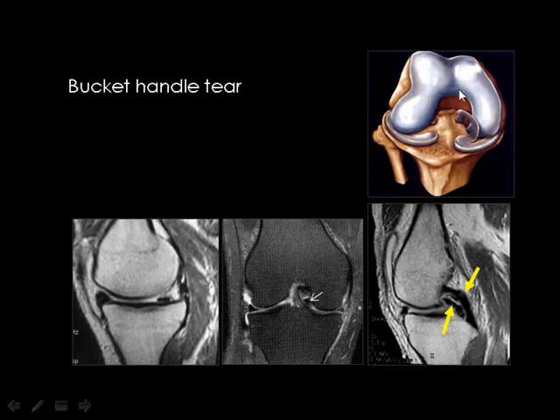And in intercondylar notch you find the cruciate ligaments, the medial and lateral. Okay? And the posterior and the anterior. The posterior is a little bit medial and the anterior is a little bit lateral. Then if you look at the level of the posterior cruciate ligament, you will see the missing part of the meniscus. Look at here. This is the posterior cruciate ligament and this is the missing part of the meniscus.